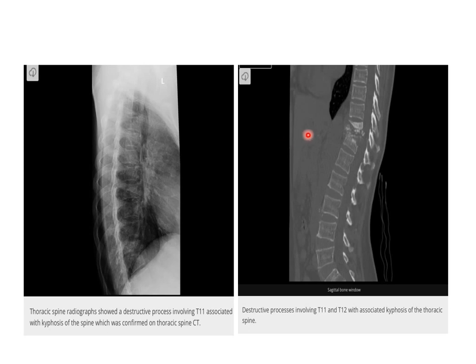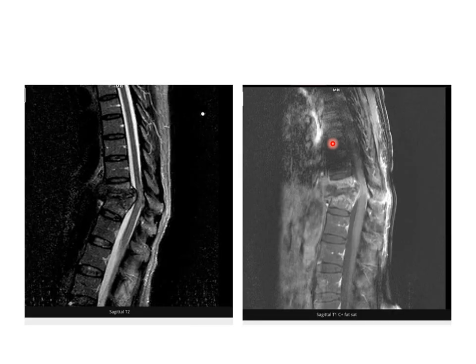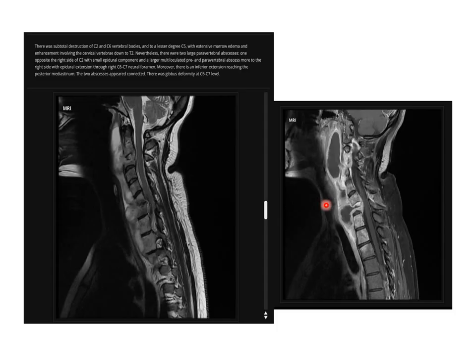There will be vertebral destruction. This is the vertebral destruction, and some sort of kyphotic angle, as you see in the plain film, the somewhat gibbous deformity. This is also spondylodiscitis because of the TB, and there is a hypo-enhancing lesion destroying the vertebra and pressing on the spinal cord. This also is in two levels.